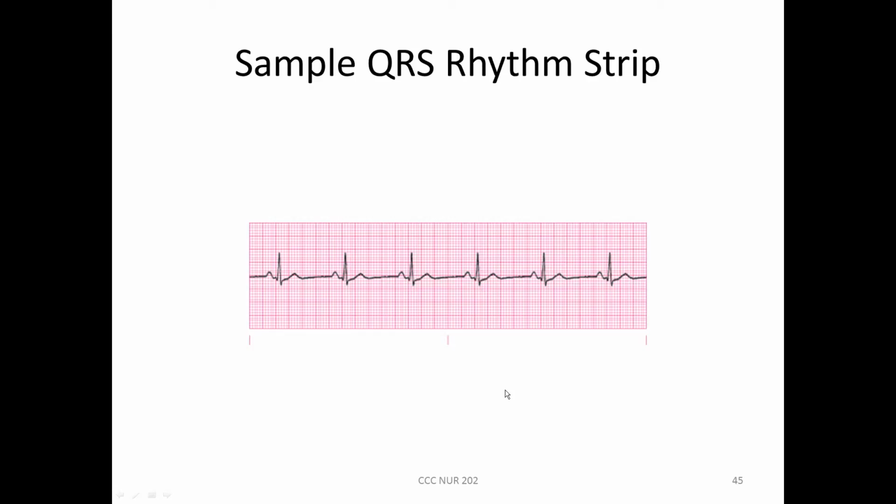Let's look at this one. So, are the QRSs similar in appearance across the EKG strip?